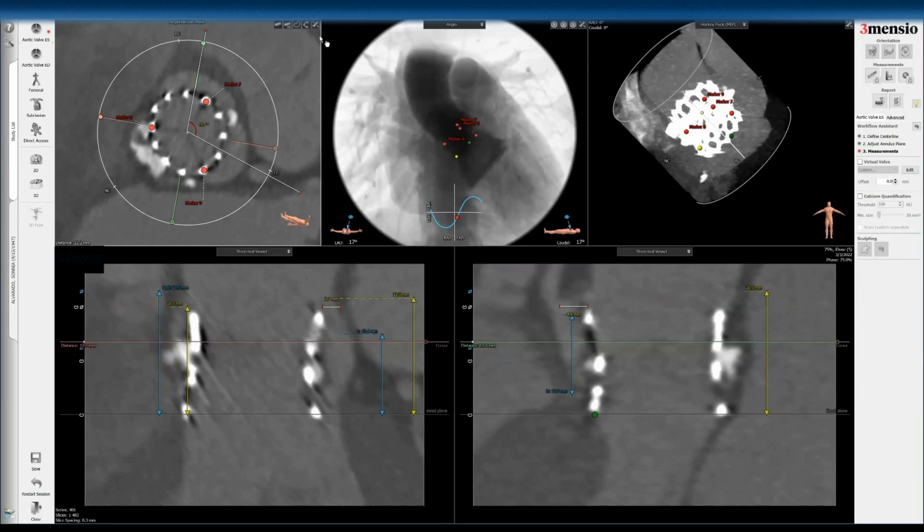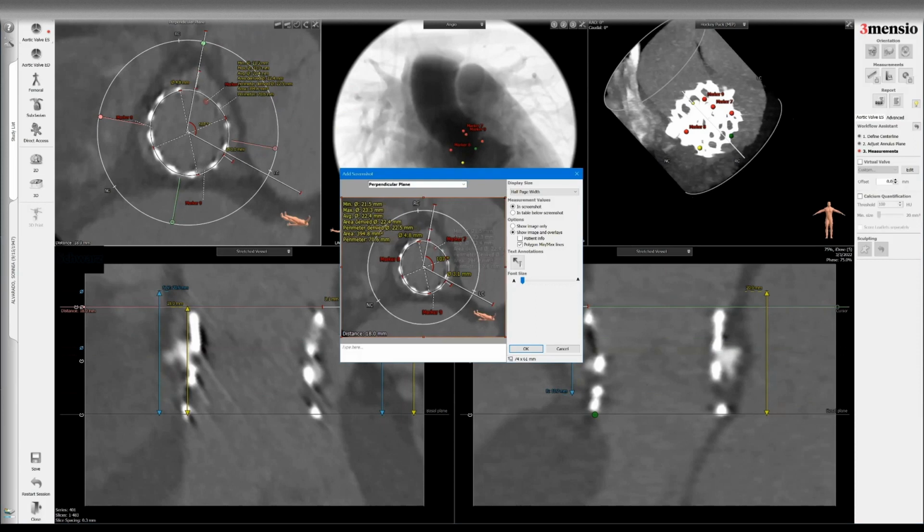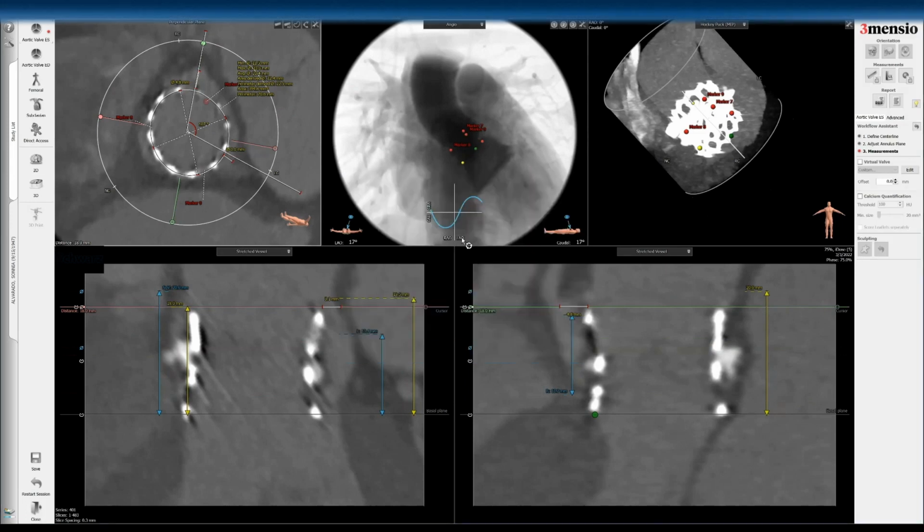Okay, and then also what we need to look at and save is the whole idea of the VTC. So we'll save this. This is a very busy slide. I'm just going to put that right there. And you can see this is the VTC of the left main and on the right, at the top.